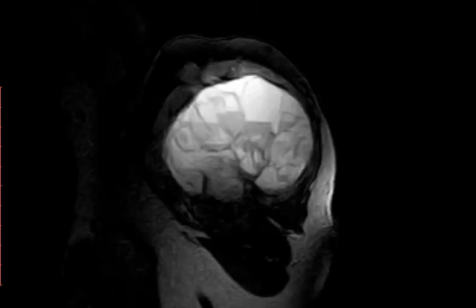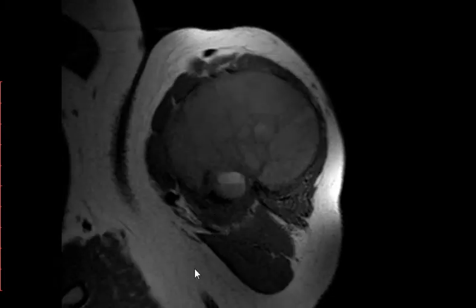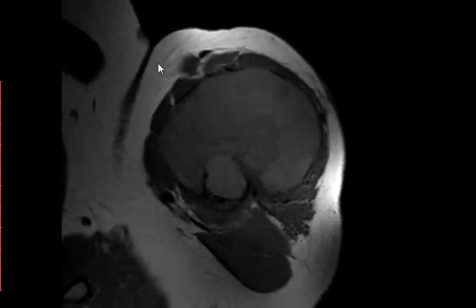show us a T1 image, for example, since we saw T2. Take this nice axial one. Again you see fluid of T1 hyperintensity. You can see areas of T1 hyperintensity suggesting what? Blood.